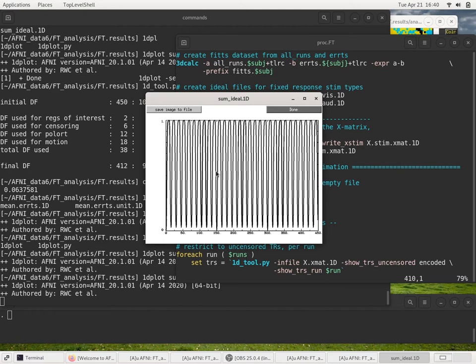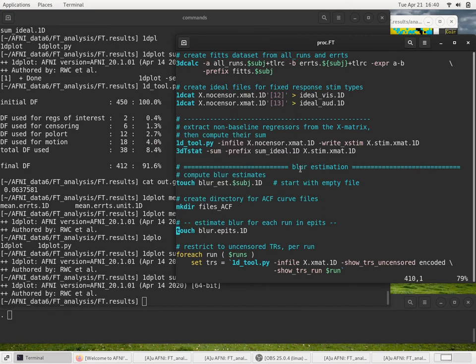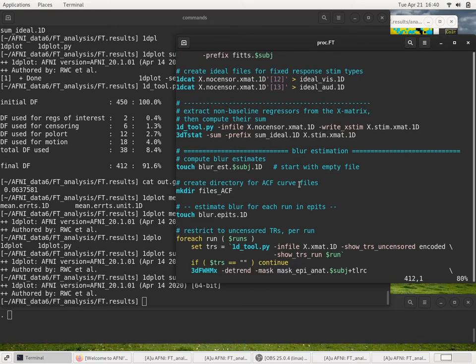I'd worry that there was a mistake there. You can't describe everything you would look for in that, because there's always something else that could cause strangeness. So you just practice looking at the data, looking at these things, and get a feel for what seems like it's okay and what might not be okay.